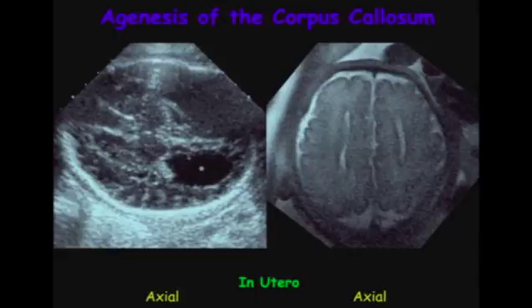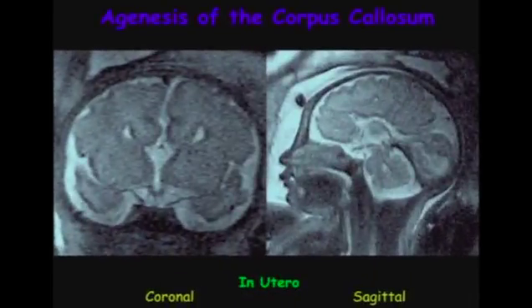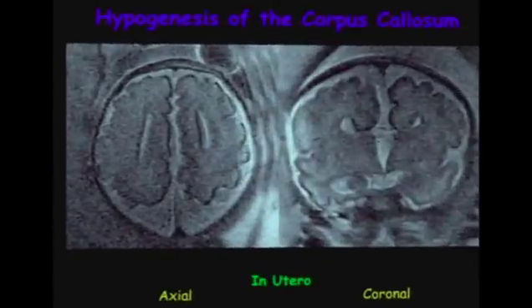So look at this fetus. We have preferential dilatation of the occipital horns, parallel lateral ventricles. On the coronal view, you have various names. If you're from Texas, the hook'em horns appearance. If you're a Vikings fan, it looks like the horns on a Viking helmet. And then look on the sagittal view, there is complete agenesis of the corpus callosum.